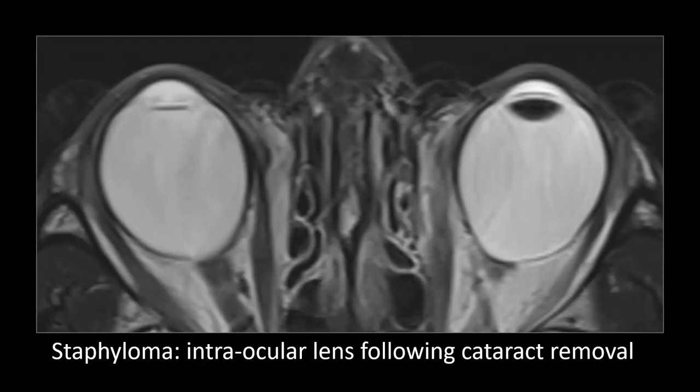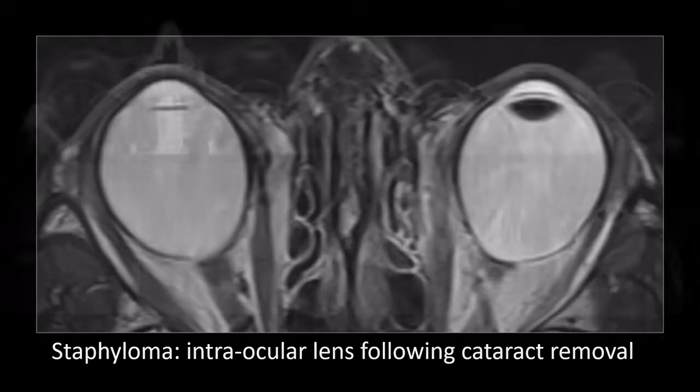A staphyloma is basically a weakening, a chronic weakening of the layers of the globe, of the eyeball wall, and is often seen in patients with chronic or long-standing myopia. So if it's very focal and located at the level of the optic disc, especially in younger patients, it's going to be a coloboma, a congenital globe wall abnormality. In older patients, if it's more diffuse and more temporal of the optic disc, it's a so-called staphyloma, an acquired condition often associated with chronic myopia.